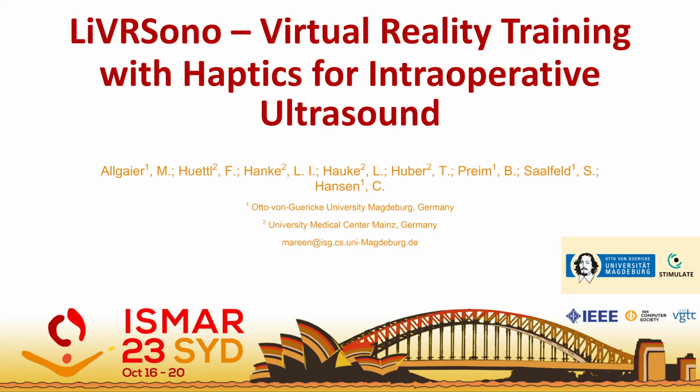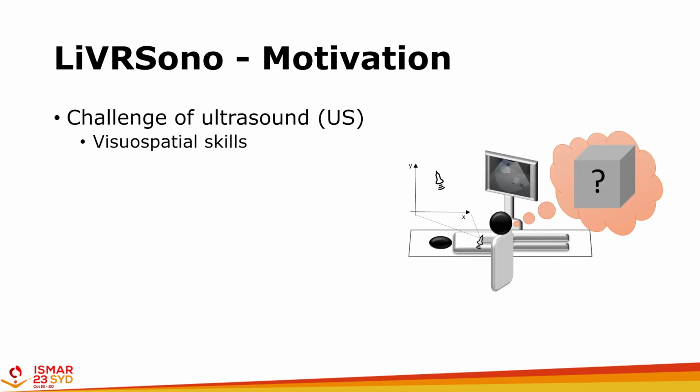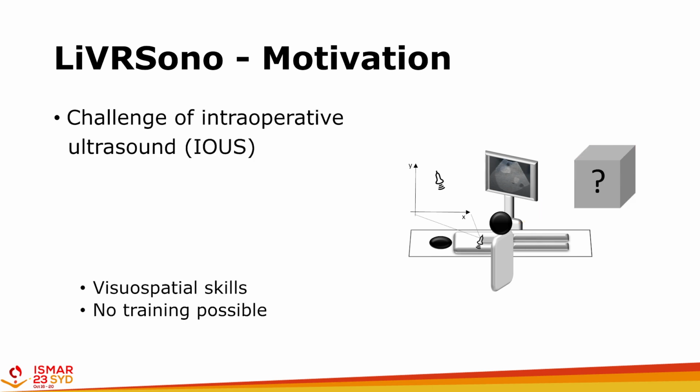Welcome to my presentation about LiVRSono, a virtual reality training with haptics for intraoperative ultrasound. Ultrasound in general requires visual spatial skills. Based on the current position of the ultrasound probe and the current ultrasound image showing a cross-section, the physician has to create a mental model of the interior structures. Without these skills, it is very difficult to interpret ultrasound images and to orient within the 3D anatomy, and these skills can only be trained hands-on.